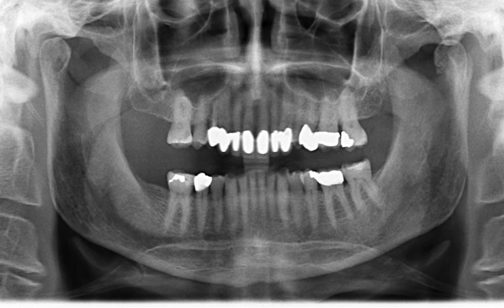So a patient presents to you saying that he fell on the sidewalk yesterday and today he started to notice that his jaw was a little sore, specifically the left jaw. So if you were the dentist seeing the patient and took this panoramic radiograph, what would you have said to the patient, or what would you have done?